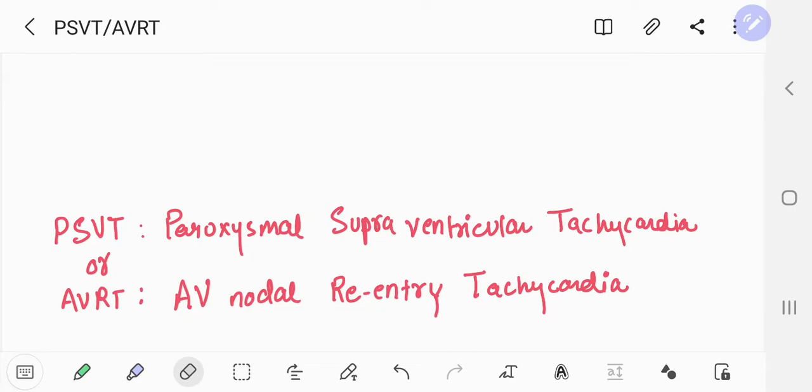In the previous video we talked about normal sinus rhythm, and I promised to make videos on abnormal sinus rhythms or abnormal ECGs. So this one is the first one on PSVT or AVRT.